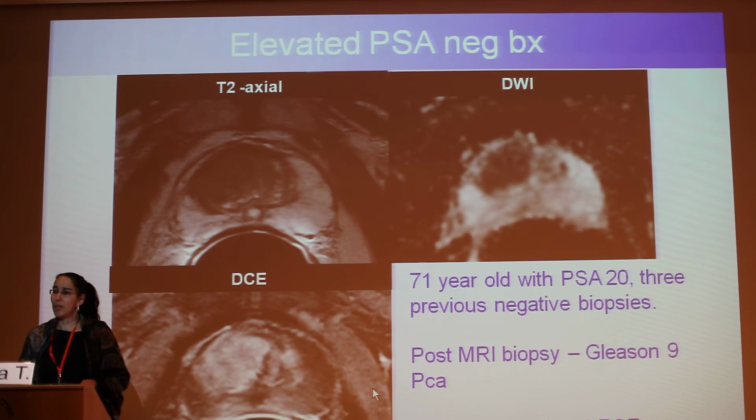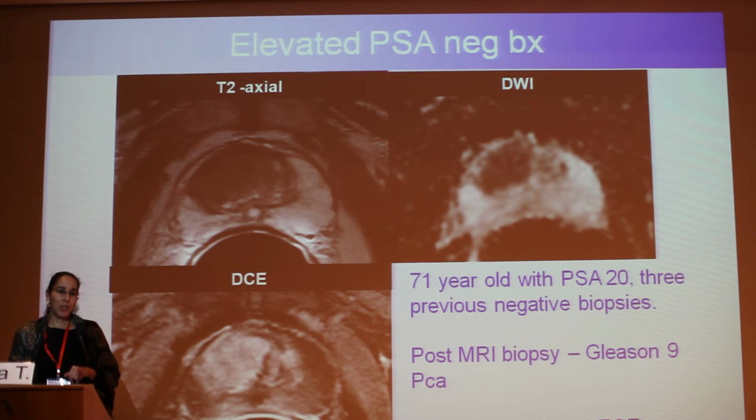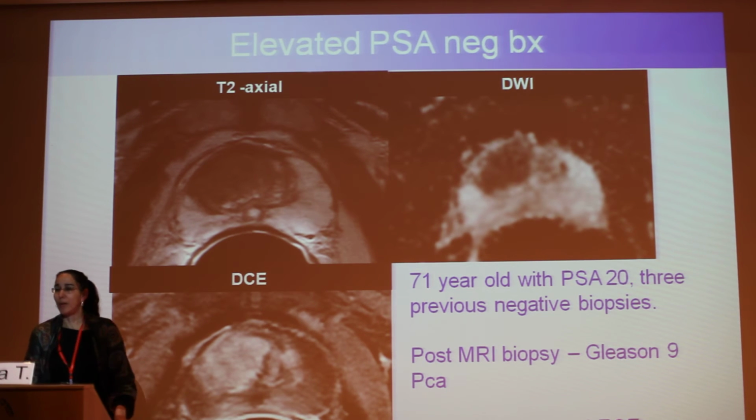And like Oik mentioned, it is very important to get early enhancement pictures, because once you miss that moment when the tumor enhances and the prostate gland is enhancing around, you're not going to see the tumor on the background of the prostate gland, which also enhances. This patient, by the way, had a Gleason 9 prostate cancer, and it did have anterior ECE at surgery.